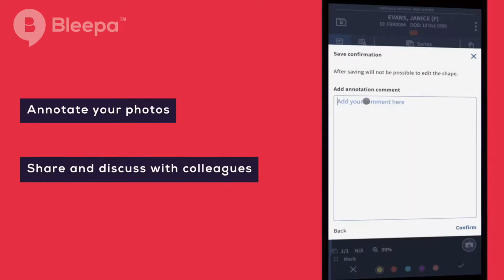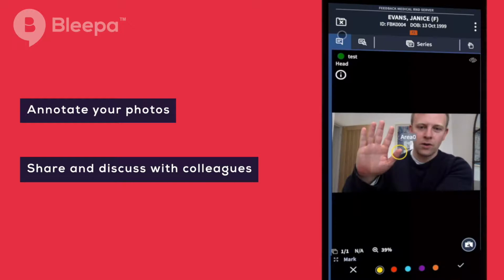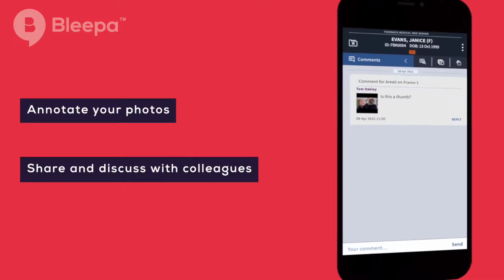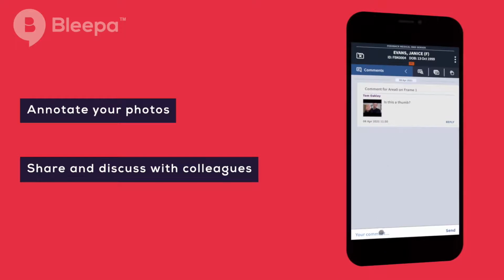and you can ask a question of your clinical team. Press confirm, and you'll see now that in chat you have a photo and your clinical question, allowing your team to very quickly see what it is you're asking a question about and then respond as appropriate.